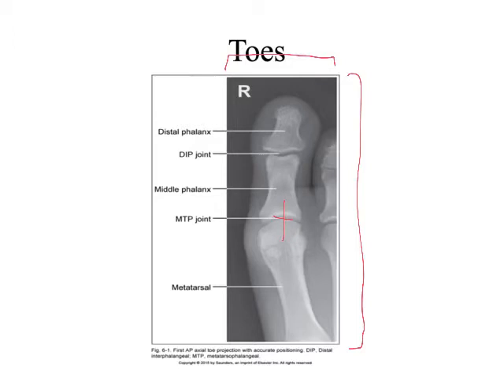Another thing that we'll be looking at is distortion of that middle phalanx, right? If I see distortion of the middle phalanx, I'm probably also going to have this joint space up here not overlapped, because this joint space is probably not going to be open because the patient's toes are curled, right? Sometimes that is the patient's natural toe position, right? But in general, we want to see that toe out there nice and fully extended, right?